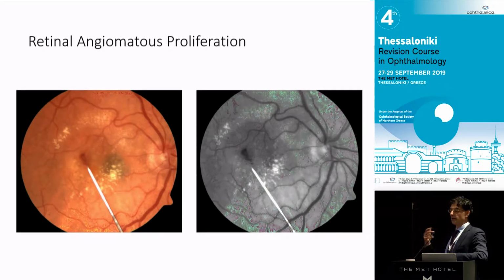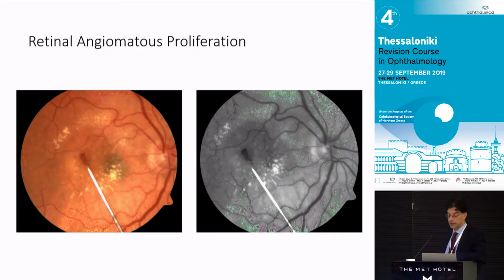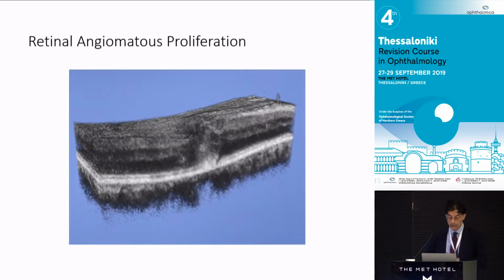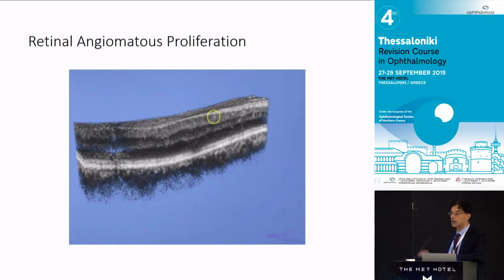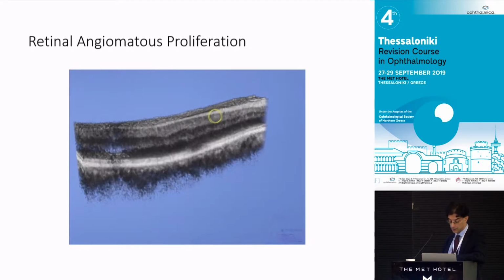He's wondering why, if it's a CNV process, would they get intraretinal hemorrhage before subretinal hemorrhage? And he thought and thought, and he hypothesized that the primary problem is proliferation of vessels in the retina, and then at some point it connects to the subretinal space. So that's often the earliest sign, parafoveal intraretinal hemorrhage, and you can see the connecting vessel stalk between the retina, and often with time you get a type 1 CNV that it connects with.